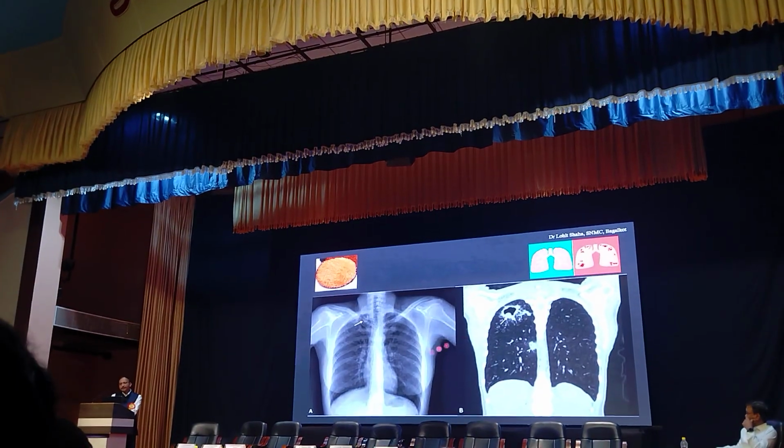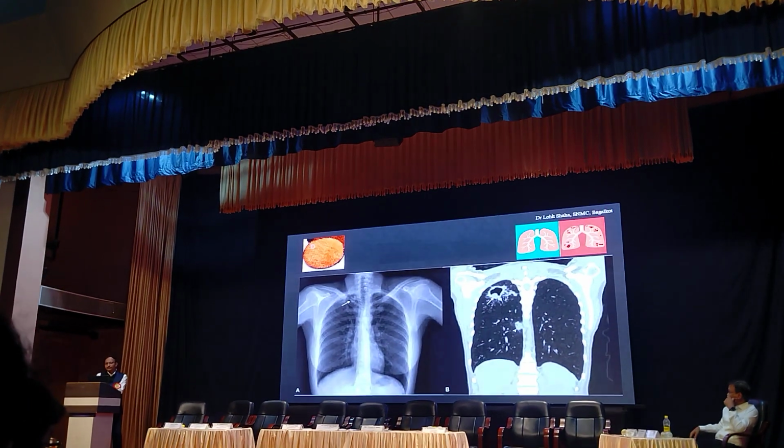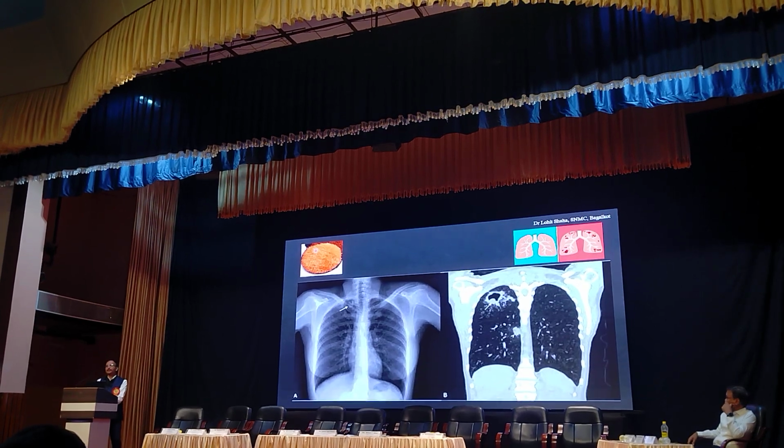Okay, so this appearance is called a powder puff appearance. Powder puff, which we use for the kids. Even we also use it, but only for the kids.